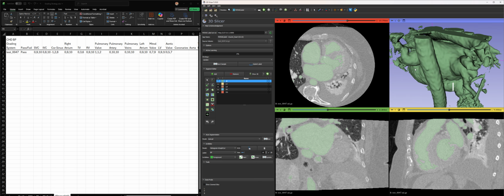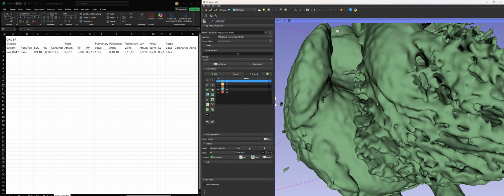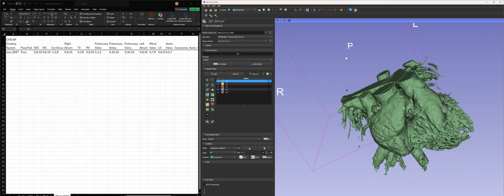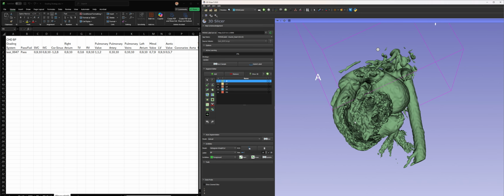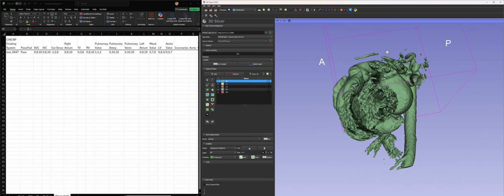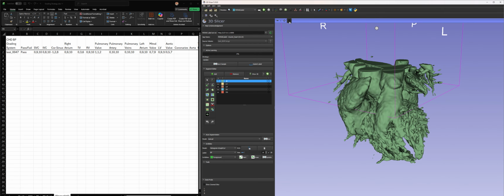And again, let's go back here and try to peek in and look down in. So here is that right coming off the anterior, right? So right ventricle, this is the coronary that comes off. And it's just not impressive on here. Here is the left coming out, and I can see it doing this and this and this. And again, it seems to be underperforming.